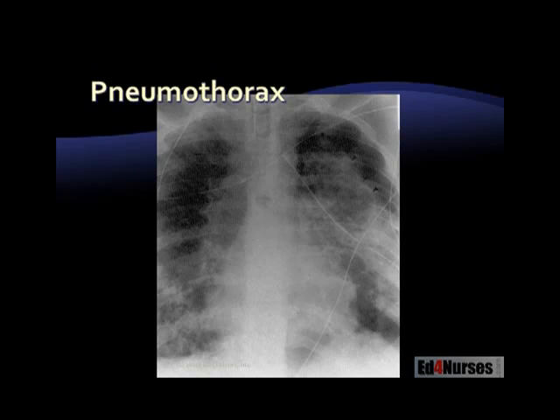This is a patient who has a pneumothorax. Now again, a lot of these slides, it's kind of hard to get an x-ray to come out good when you're looking at it here on a screen on a video. But the lungs are expanded. Okay, we have a nice diaphragmatic arch, nice costophrenic angles. Where'd the heart go? Okay, this is a PA view. It's looking from the back toward the front. That's why you're not seeing the heart as well.